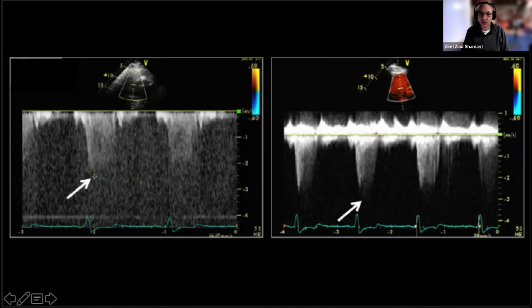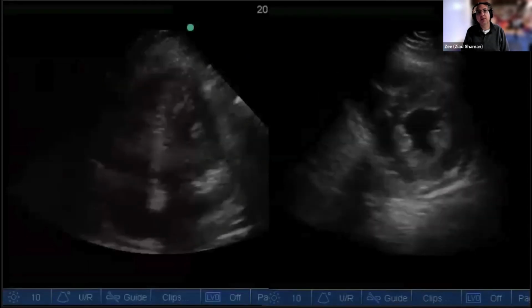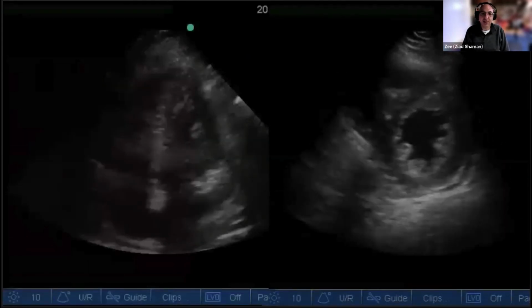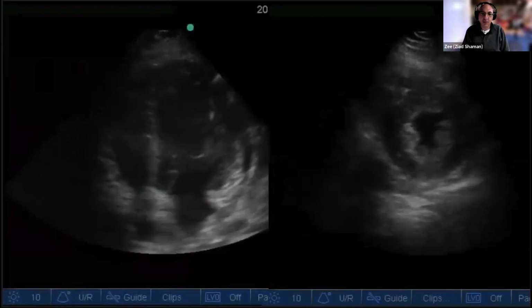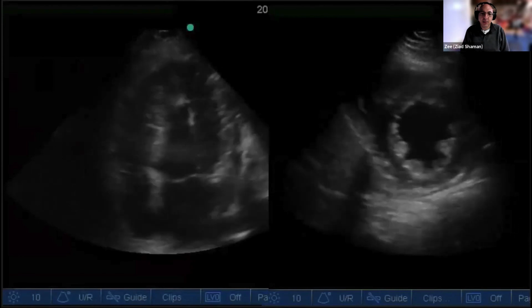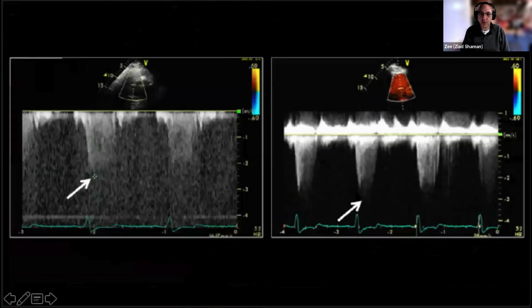Call it 3 meters per second. That gives you squared 9 times 4, 36. You look at your views to decide, because you didn't really cross the 3.4 margin on your measurement, you want to look for 2 more supporting findings.